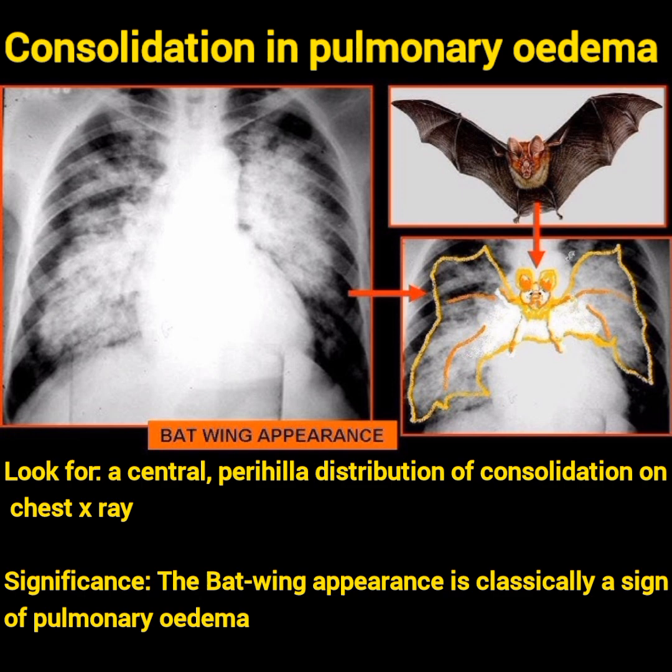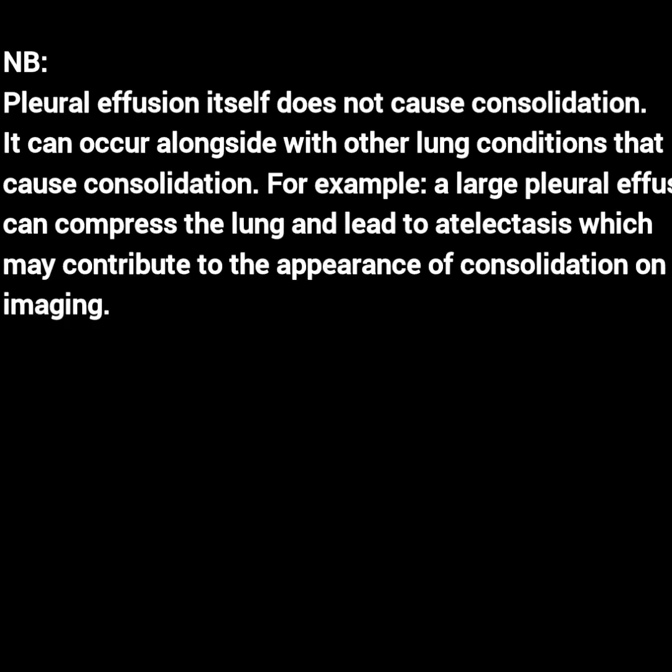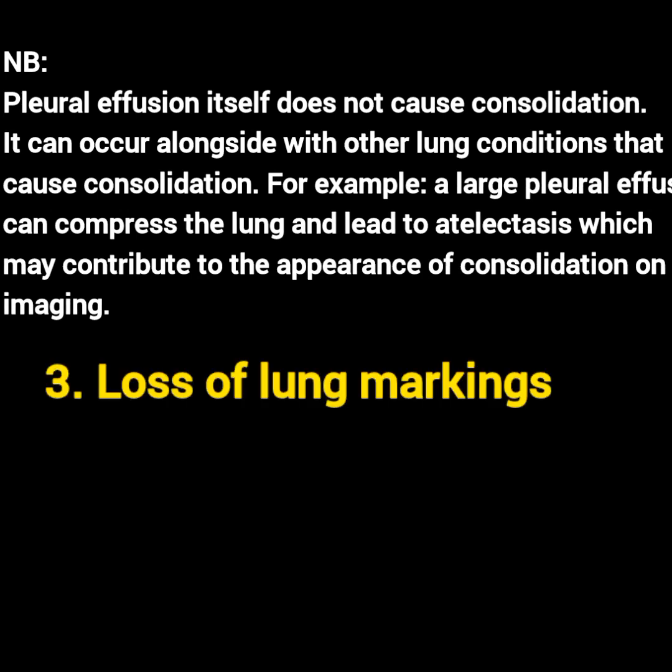Also note that pleural effusion itself does not cause consolidation because the fluid is in the pleural space and not in the air sacs as in consolidation. It can only occur alongside other lung conditions that cause consolidation. For example, a large pleural effusion can compress the lung and lead to atelectasis, which may contribute to the appearance of consolidation on imaging. Also check any loss of lung markings.